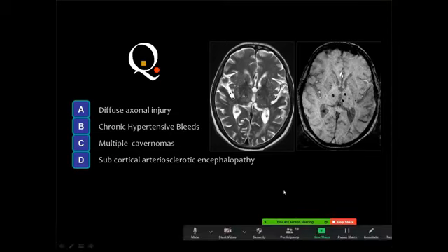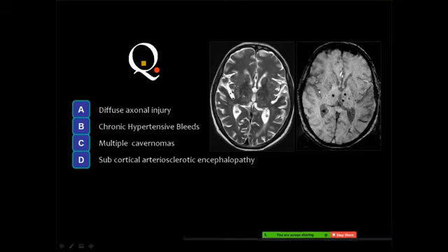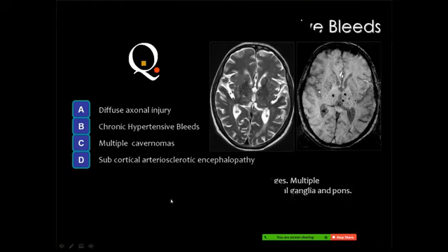But you know, in the recent lectures, that the patients with hypertensive encephalopathy may develop microbleeds, and that's why the gradient images or the susceptibility weighted images are essential in the protocol of examination of such cases, because if you detect microbleeds, then you should mention this very clearly in the report to guard against the anticoagulant if the clinician is about to give the patient any form of anticoagulants.